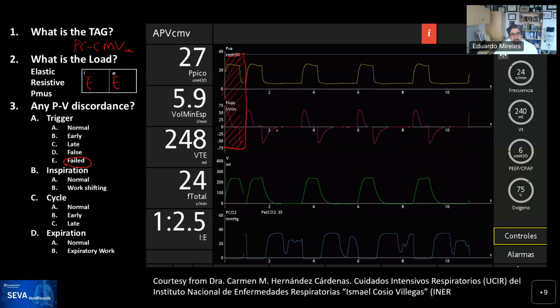Rob says, if you look at it, it seems to be crossing over it sometimes, but because the scale goes all the way up to 75 liters per minute, it may be hiding small aberrancies in the flow. And the pressure, because during PEEP you're controlling the pressure during the expiratory phase, you may not see aberrancies either.